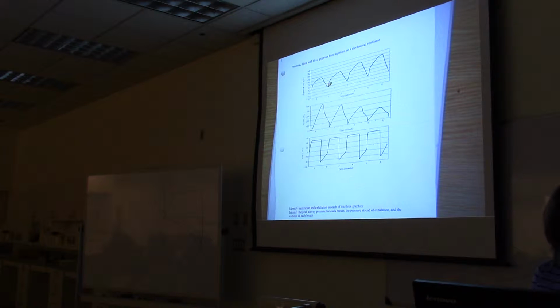All right. And on this one, what are we measuring? Volume. Air going into the lungs, inspiration. And then air coming back out, exhalation. Looks like there's a little bit of a volume loss here. It didn't go straight back to baseline.